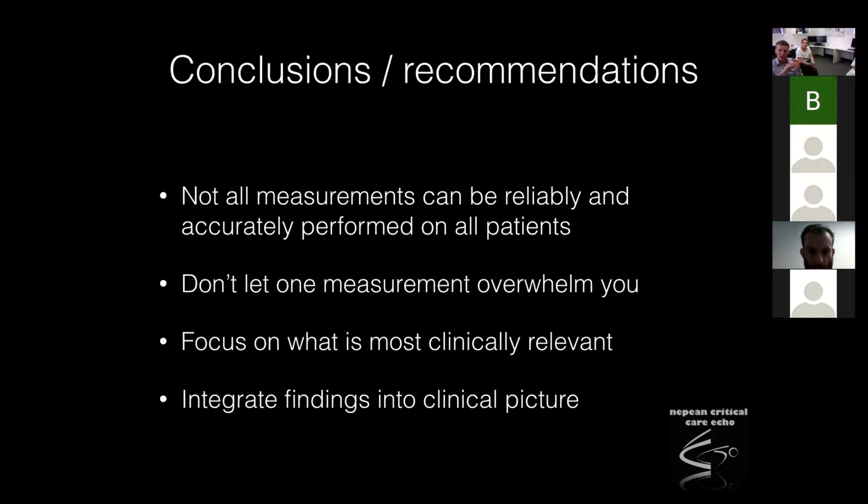So look at everything together, from the tissue Doppler to subjective assessment to symptoms. Okay? And then the last thing, most important to say, is that you've got to integrate these findings into the clinical picture. And if something's not matching up, just try and think, have you made the right conclusions with your echo?